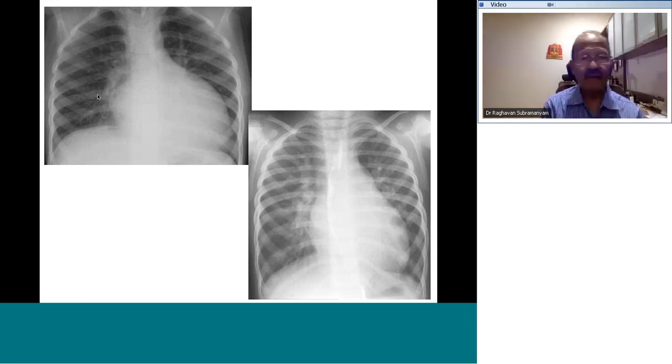Therefore, don't be surprised in an infant if you have a very large plethoric lung, you may have a frank appearance of pulmonary edema. Therefore, these are not watertight compartments. A very plethoric lung can have some evidence of pulmonary edema. A very edematous lung could have some end-on vessels and appear to be like plethora. Therefore, there is always some overlap in the X-ray sign. Your interpretation must be based on your clinical finding and what you expect in that particular patient. Please correlate your clinical finding before you give an X-ray report.